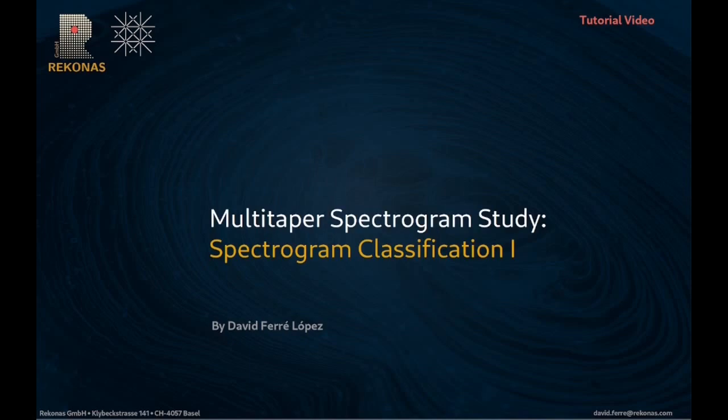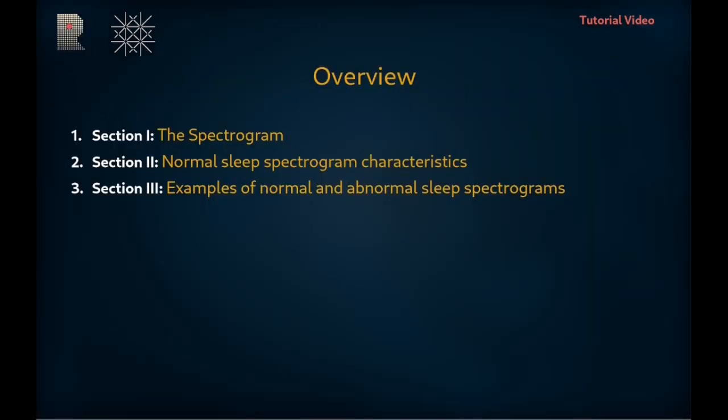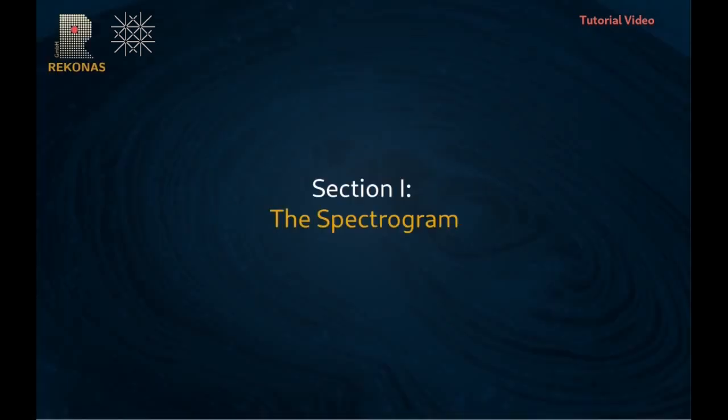The Spectrogram Classification Part 1. In this tutorial, I will explain what a spectrogram is, how a normal sleep spectrogram looks like, and how sleep abnormalities present themselves in spectrograms.